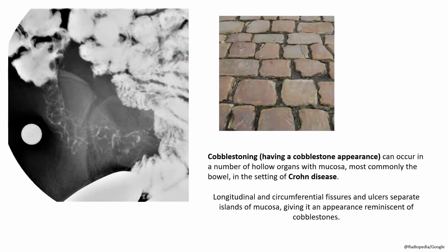Next case, what is this sign? This is cobblestoning or cobblestone appearance, which indicates inflammatory process which is affecting the mucosa, more commonly in Crohn's disease. So it can affect hollow organs with mucosa.